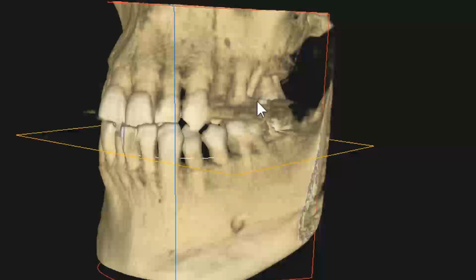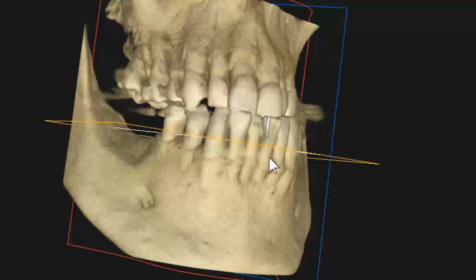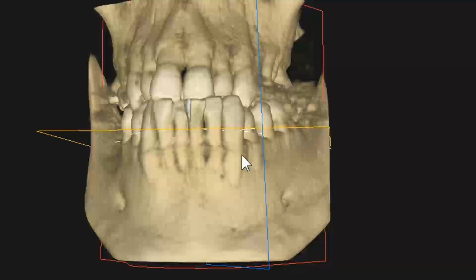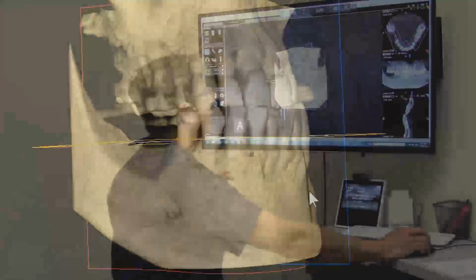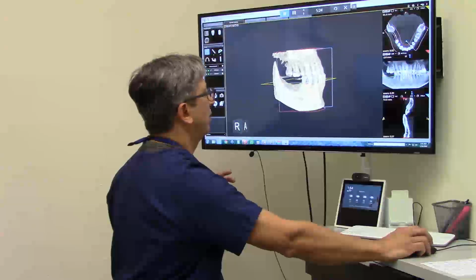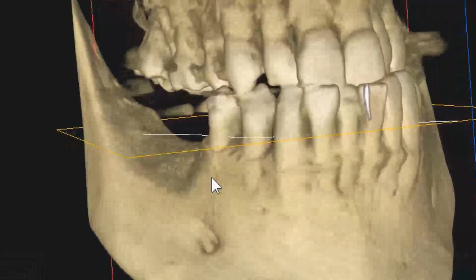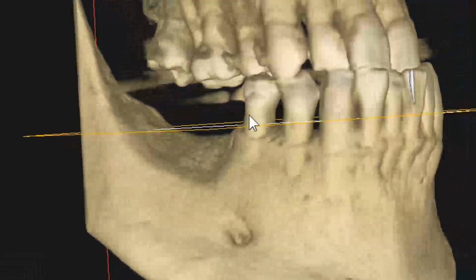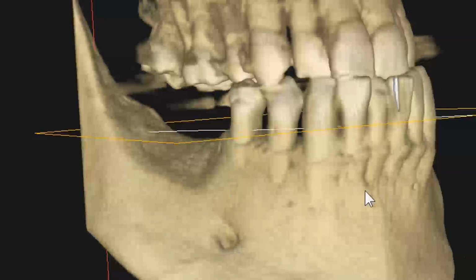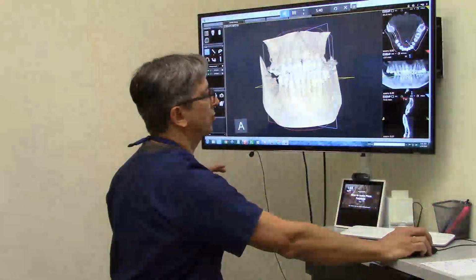But he's an ortho patient. See how his teeth are crossbite? We're not going to categorize him as the ortho patient here, but you can just take a look at that. But he's got a lot of healthy facial bone going along here. And here's where he has that ridge height problem right in here, right? So if we look right into this area, that's where the defect is when he had those teeth extracted or had infections. So that's where we have a little bit of concern where it has hide up. But his nerve is so far down, I don't have a concern about that.